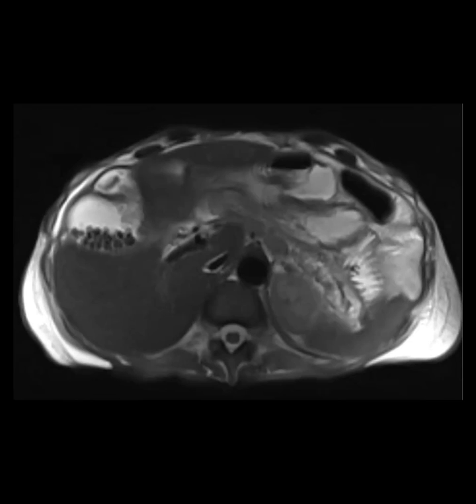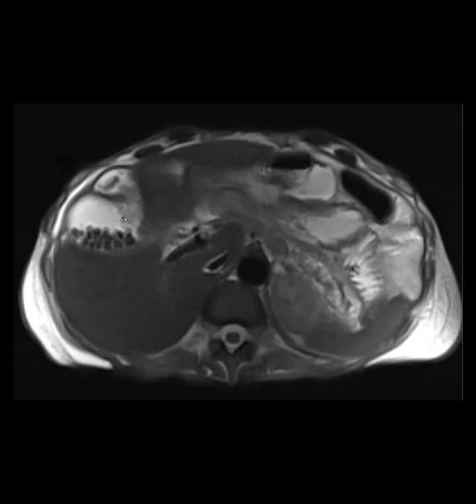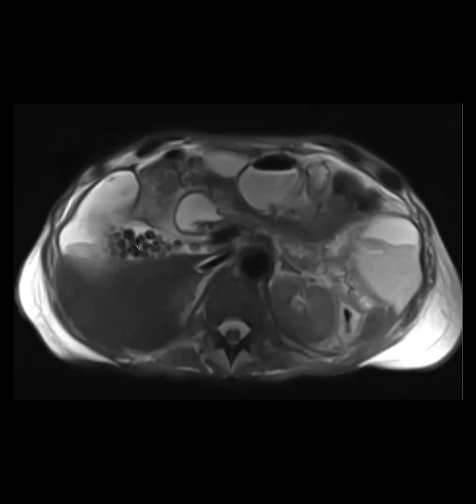I can't see the chat box. I mean, the two cases I've had of gallbladder rupture have been cancers. So I don't know what that isointense gray-looking thing is there. This guy here? Yeah, exactly right, in that neck.